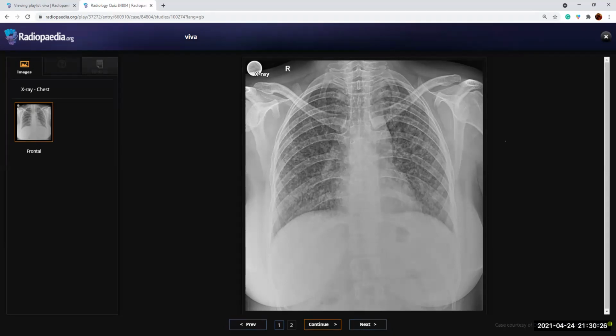I forgot the clinical history. The patient, sorry, presented with cough. Okay. So if this patient is a smoker, this can be the centrilobular nodules with some cavitary changes. I am not getting that name.